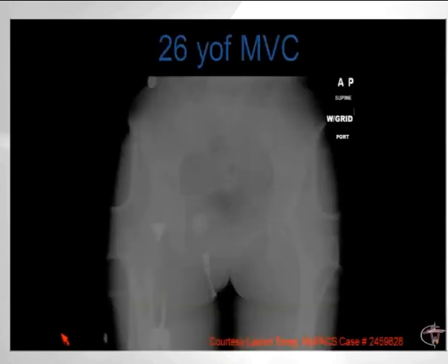This can also be important for the clinical setting, and this is a case to illustrate this. This is also my last case. This lady crashed her car and was brought to our emergency room. She wears a common jeans brand that uses an inverted triangle, and guess what? There is a lock-picking key in her pocket. I would like to draw your attention to the gluteal fold because there's no radiodense material in her gluteal fold.